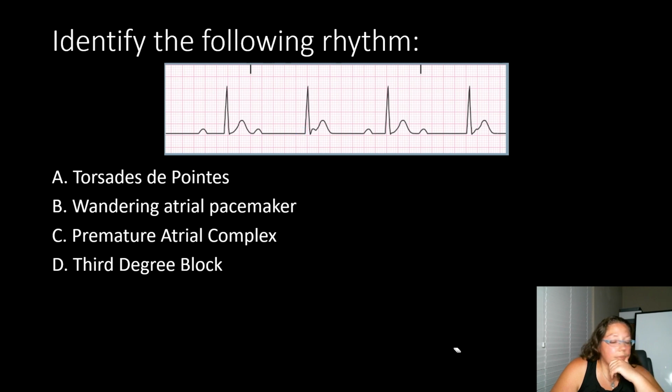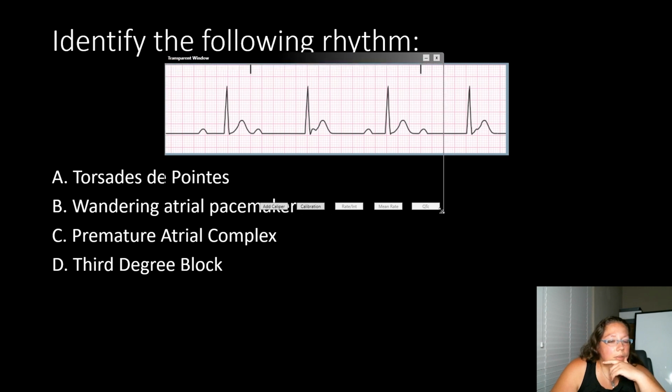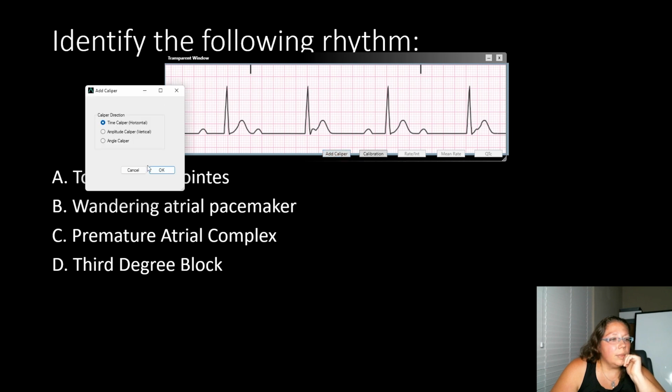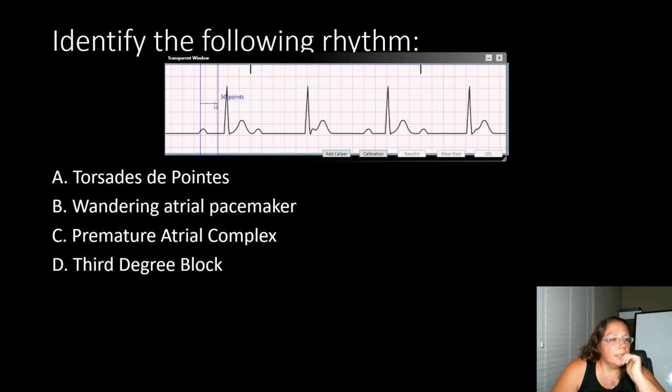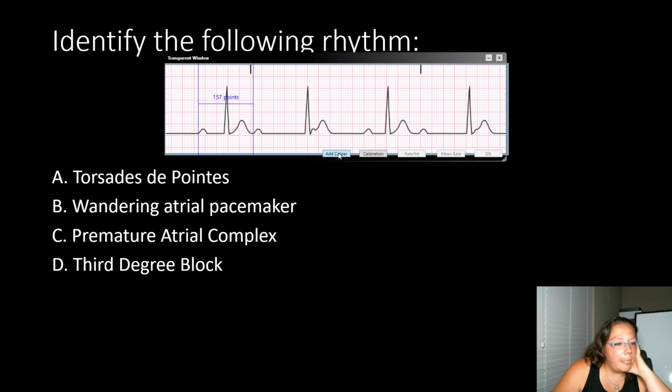So let's get our trusty calipers out. I think this is my last question for you guys. Let's add a caliper. Let's march out these P waves. Oh, you know what? I want to add the second caliper. It's easier that way.